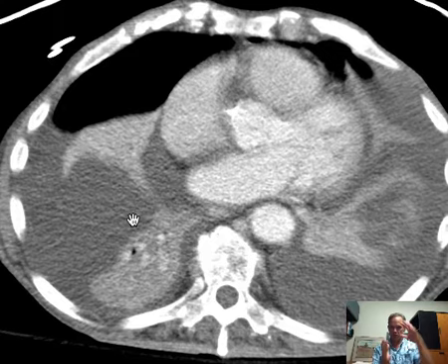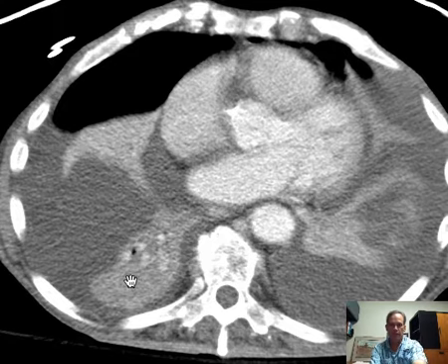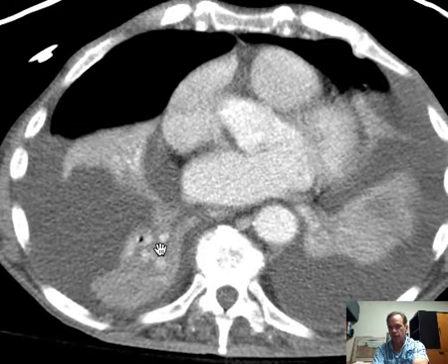When the lung, let's say we have a lung like this, has fluid collecting along around the base, it squeezes against that base much more so than the upper lobes very often, and that causes this compression of the involved adjacent portions of the lung that are associated with the pleural fluid. It squeezes them down, just as a basic simple mechanical pressure that forces the air out and causes atelectasis.